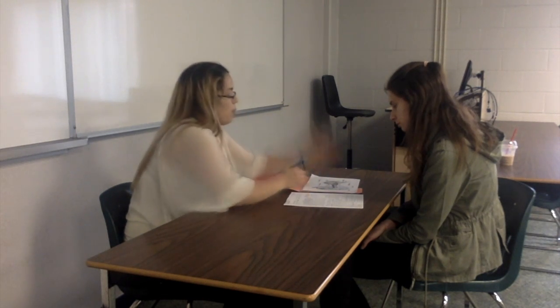Okay. So all of your greater than and less than symbols are all above 25. So you have perfect hearing when I go directly to the inner ear. Okay. So what this says is since your left ear is below the 25 mark, where your hearing loss occurs is somewhere between the middle and outer ear. Are you following along? Yes, I do.